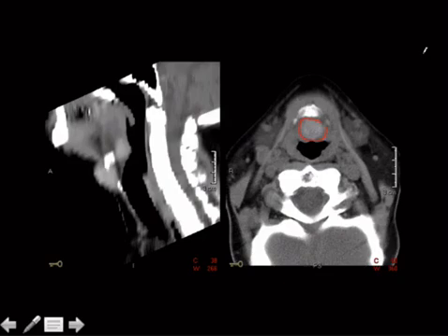And the reason it looks dense is because it's full of iodine. Remember that when you give IV contrast, the reason IV contrast looks dense is because it's iodine. Iodine blocks the X-rays. Iodine looks dense. Thyroid looks dense, whether or not you've given contrast to it. So dense things in the neck, especially in a non-contrasted study, are residual thyroid tissue.